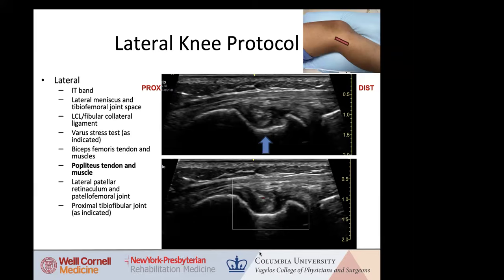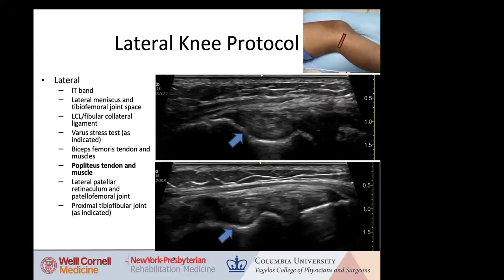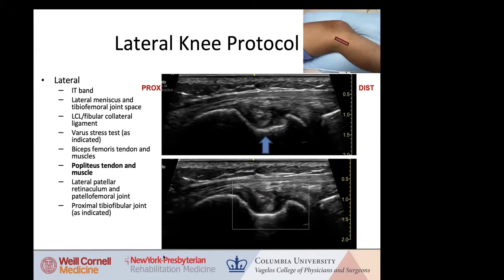So as you get those images of the popliteus that you're showing here, marching back through is really helpful. And then just for people who maybe haven't scanned this area a lot, one thing I noticed on that top picture, associated with the other finding, you had the lateral meniscus tear.